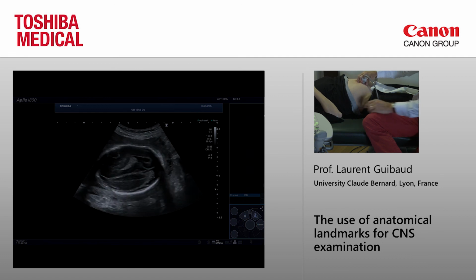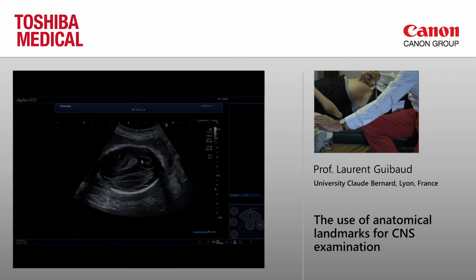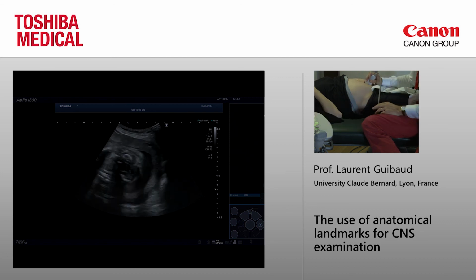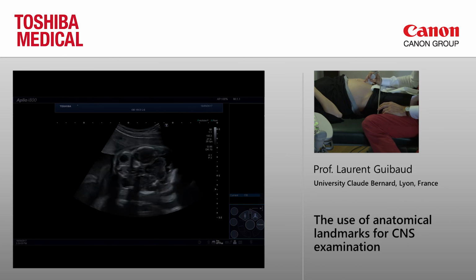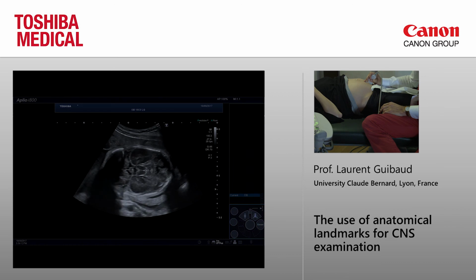It's not to measure because I'm completely oblique, but it can be very interesting to look that the ventricular wall is smooth, that there is no echogenic content within the ventricle, which can suggest intraventricular hemorrhage, that there is no cyst here. In CMV, there can be cysts. So this is a useful view when you want to have an idea of the integrity of the proximal hemisphere.